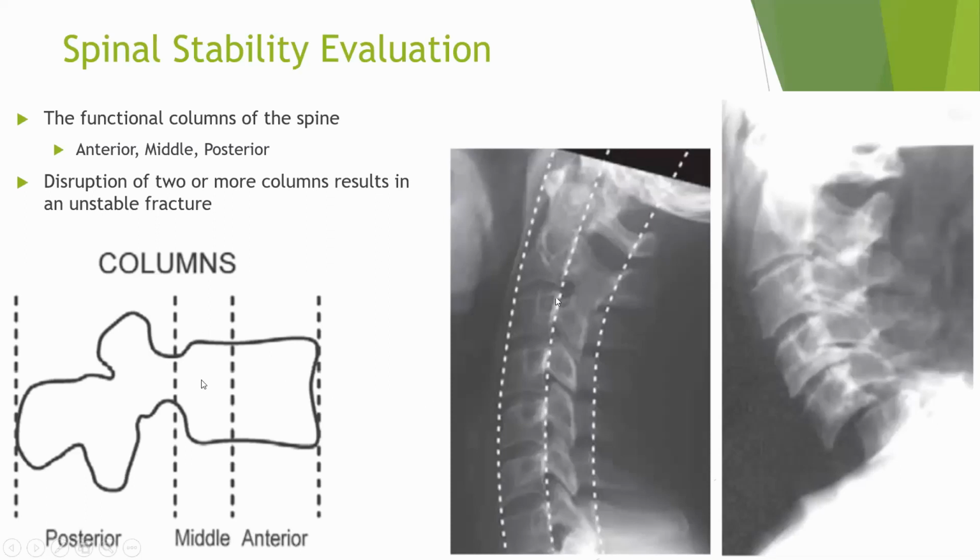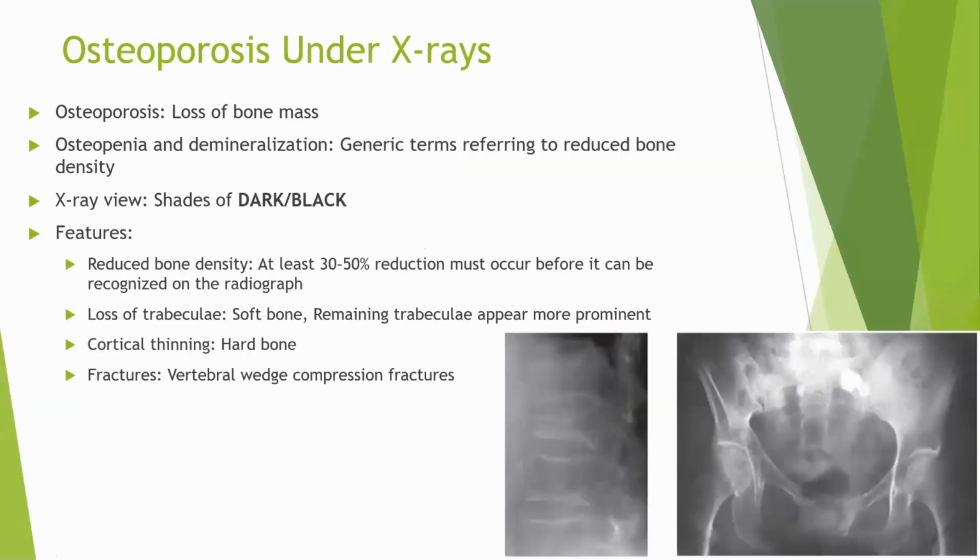The anterior, middle and posterior columns of these 4 segments with the lower segments are not even matching. You know this is not a good scenario for your patient. Emergency situation, refer to the concerned individual to either hospital or physician, whatever you deem is necessary.